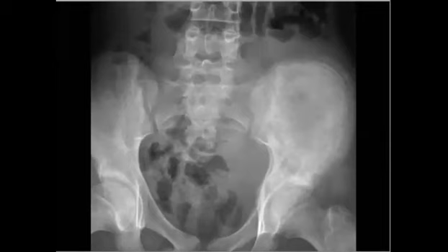When you go to the pelvic bones, again, when you find a pediatric patient, how can you describe this appearance? So Ewing sarcoma will be a differential, I agree, Marwa, Shayma. So the left iliac bone, how do we describe it? There is the osteal reaction. What about the density? Yeah, permeative, lytic, and sclerotic lesion. It looks like an aggressive lesion. Like the flat bones, if you find Ewing sarcoma, you will search for bone metastasis, lung metastasis.